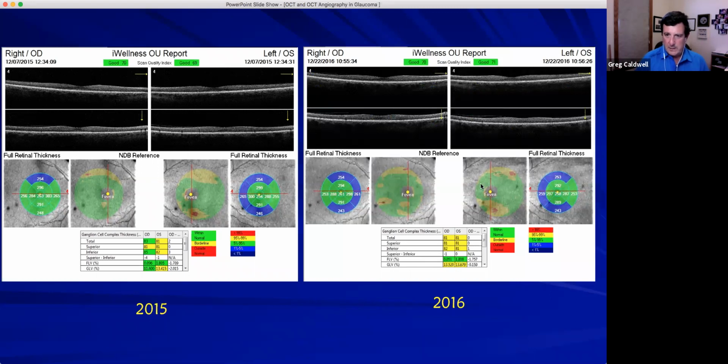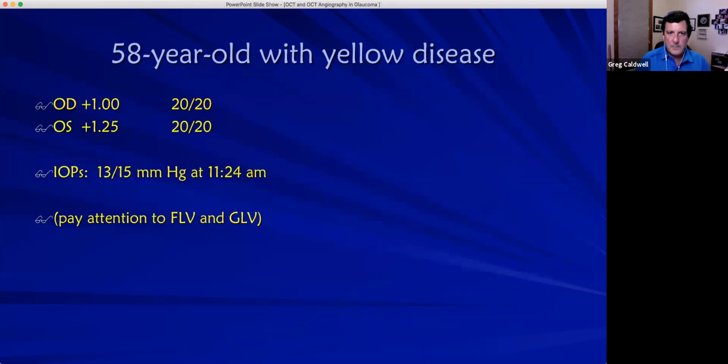So we had a patient before that had a 110. This one here is 81. That's why I like knowing 85 to 100 is pretty much where I see them all day long. 92 to 95. If they are 81, 81, 82, 81, 81, 81, do you think a disease process is causing that to happen? Most likely not. It's just physiologically thin for this patient and normal.